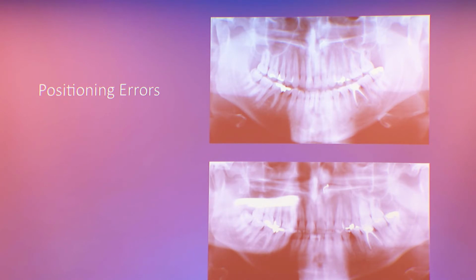Katie, was this yours? I think this was Katie's, yeah. So, first pan, what's all that about? Second pan, it's not there. Well, what happened here? I can't see from where I am. There was enough rotation or tipping of the head that all of this metal was ghosted up here. Okay, so positioning is very important.